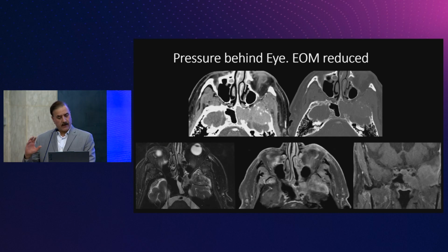This is another similar spheno-cavernous lesion, which is destroying the bone and extending into the sphenoid sinus. Can this be meningioma? Unlikely, because remember, meningiomas induce osteoblastic bone changes. Atypical meningiomas and solitary fibrous tumors will not, but typically what we associate with meningiomas is an osteoblastic reaction in the bone.